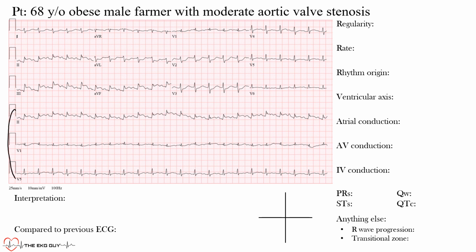In this case, I would probably use V5 because you can see these R waves here. From one R wave to the next is called the R to R interval, and what we want to do is measure the R to R interval. So here's the next R wave, from that one to this one. Here's another R wave to this. These are all R to R intervals, and if you were to measure all these out, you would see that these intervals are quite consistent.